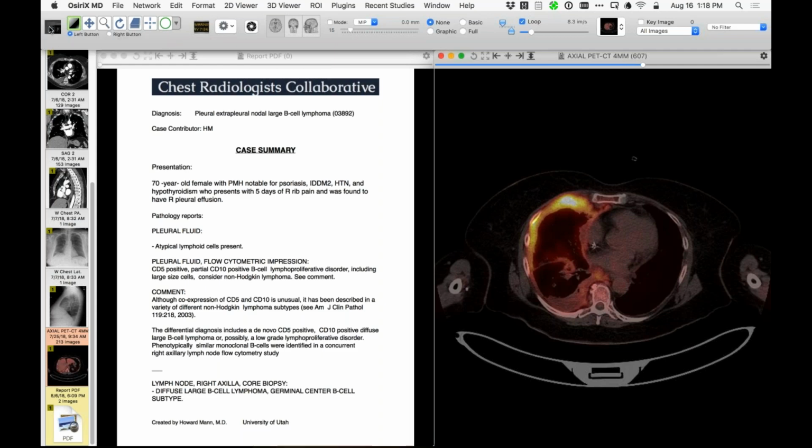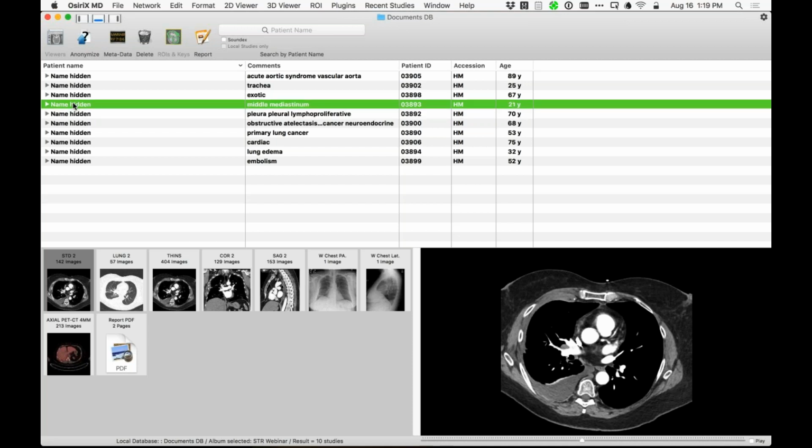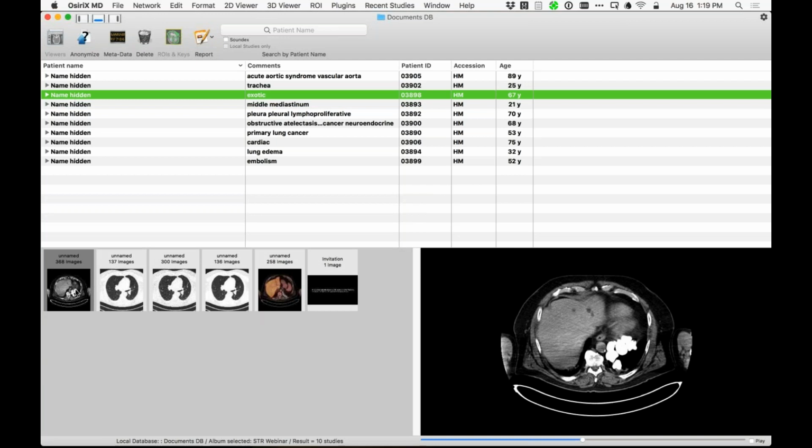So that's a lymphoma. I think it also illustrates one of the pitfalls of pulmonary embolism imaging, and it's one of my big pet peeves when you have pleural abnormalities, is the early arterial phase doesn't give it enough chance to enhance. But if a later phase had been done, or especially if you have basilar pleural abnormalities and subsequent abdomen and pelvis CTs are done, it's always important to look at the more delayed imaging to really see nodules that enhance or abnormal thickening. Yep.